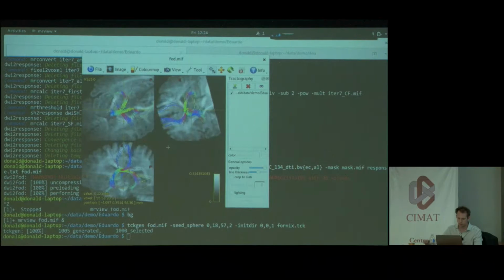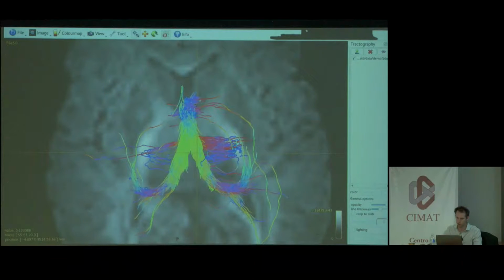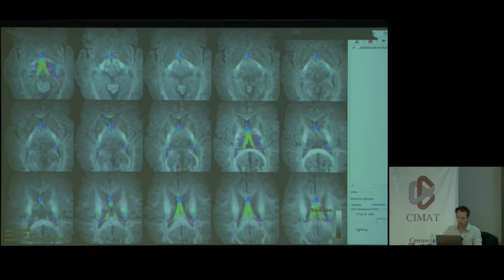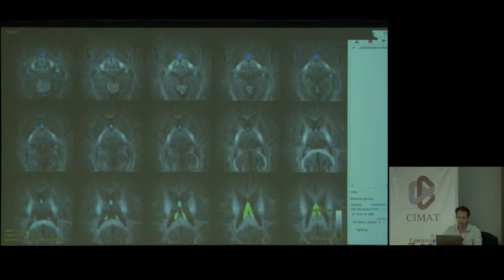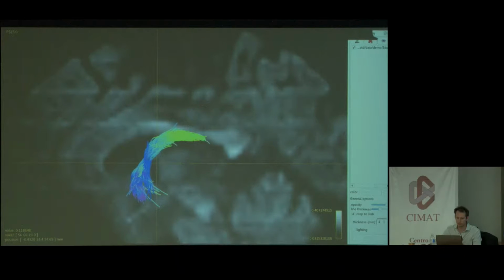And you can also display that if you want as, let's go full screen, using the lightbox mode to see it at different levels. If that helps, crop to slab, there we go. In various orientations. Okay, so that's that.